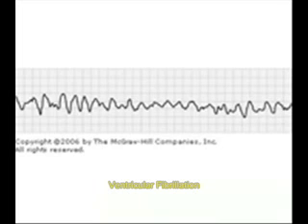In fact, you can see in this EKG ventricular fibrillation. This is a medical emergency. So this needs to be treated, and the main treatment is defibrillation. So ventricular fibrillation is ventricles are not producing any output.